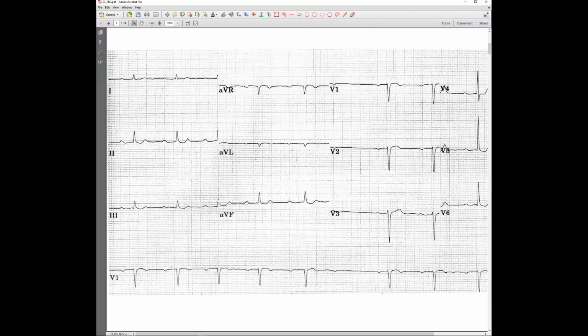Lead 1 is almost equiphasic, but not really. It's positive, slightly positive. So it's slightly pointing between 0 degrees to positive 30. No. If lead number 1 is the smallest one, it means that the axis should be close to 90, yes? So this has to be between 2 and 3, but it's not 90 because it's positive, so you can say it's about 80. Okay? This should be about 80.